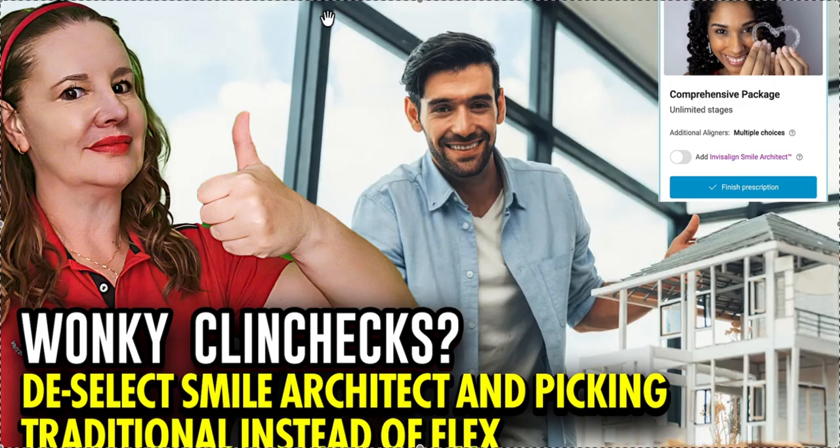But yeah, Flex is nice because it's fast and it gives you something to show them, but then it takes me so much longer to fix it to make it good. I don't know. The jury's still out on Flex. But Flex with personalized plan has been great. So that's just my thoughts.